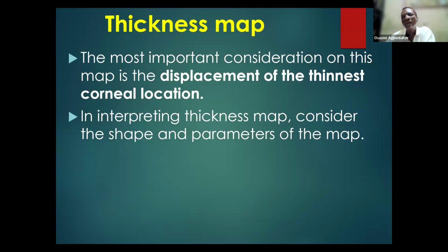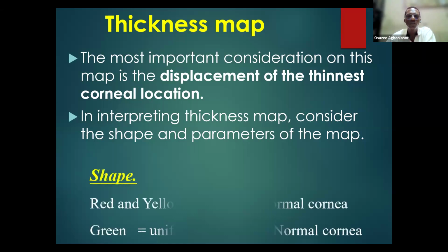Is it towards the right? Is it towards the left? Is it inferior? How far is it? And all of that from the central cornea.